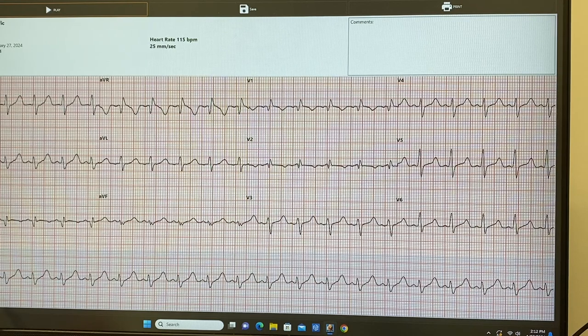So for the ST segment, we're just looking at the ST. Is it elevated, baseline, or inverted? It's elevated, right here. How elevated? It seems to be on an incline, about maybe 1.5 small boxes. One full, and about half of another. And then what else do you see? And then we're leading to an elevated T wave. A tall T wave.